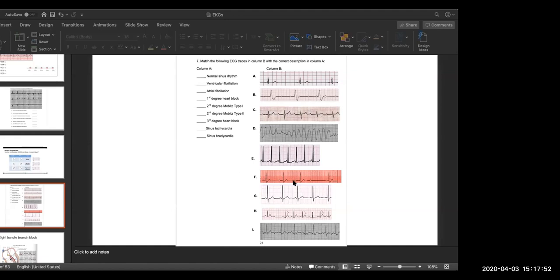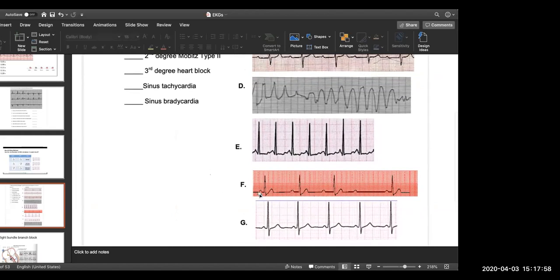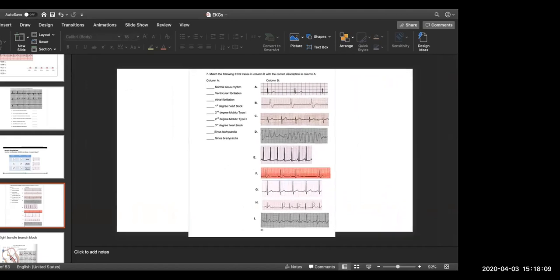Really? Well, the other one, you're not lengthening the PR interval? No, in H, yeah, you are. You can eyeball. No, not for this one. The other one, what is it? Type 2, you don't lengthen it, no. Right. I meant to say in the picture, H is not. I can't tell. It's too small.